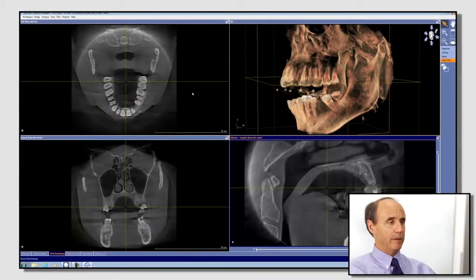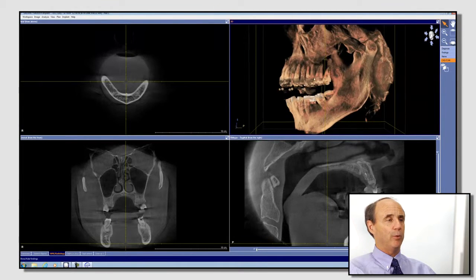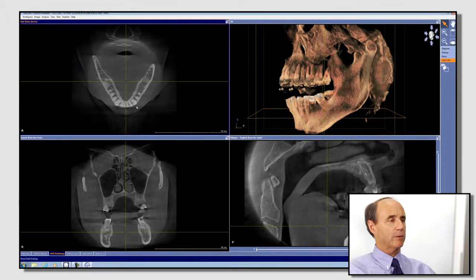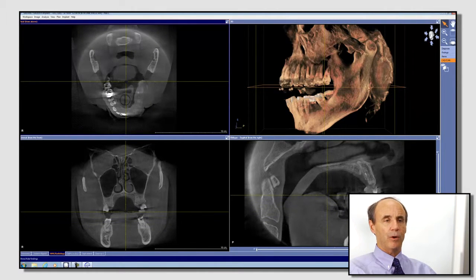You would begin by the axial or coronal view, starting at the bottom or top, and this again is where it helps to have the 3D view, and proceed upward, looking at cortical contours, looking at differences in symmetry. In the axial and coronal view, you have a right and left side, and you can observe differences in the right and left side as you move up or back and forth through the anatomy. And again, we're following the progress of this orange outline image layer to know where we are in the patient's anatomy.